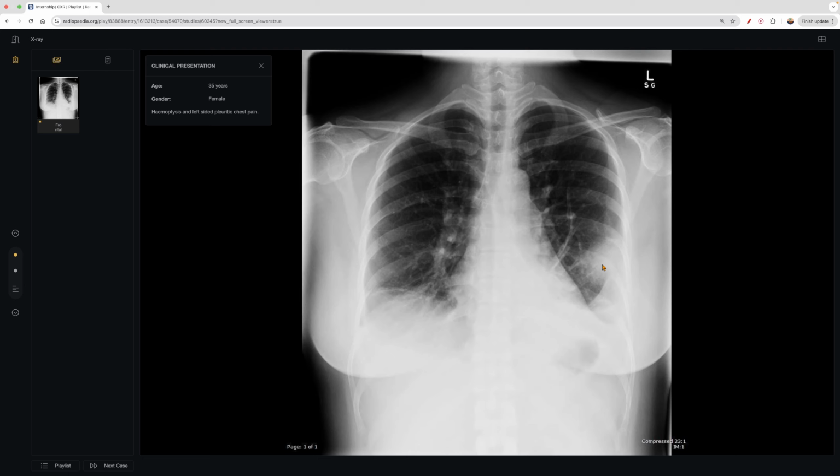So with that being said, the pulmonary embolism causes occlusion, the area becomes ischemic, and it can infarct, but it also causes bleeding, and that's why the patient has hemoptysis. And so this is called a Hampton hump sign. Clinically, I would say it's probably never going to come up, it's very rare. But in terms of the board exams, it always comes up as a sly little question, and you just need to be ready for it.